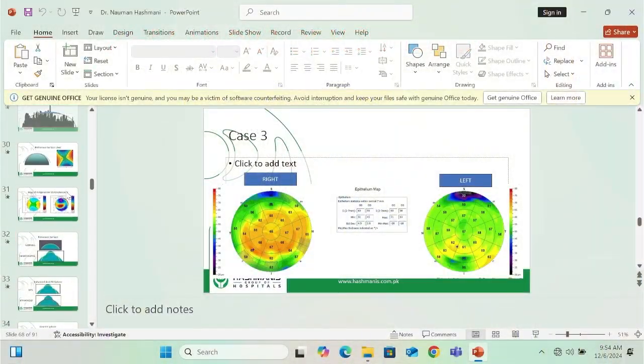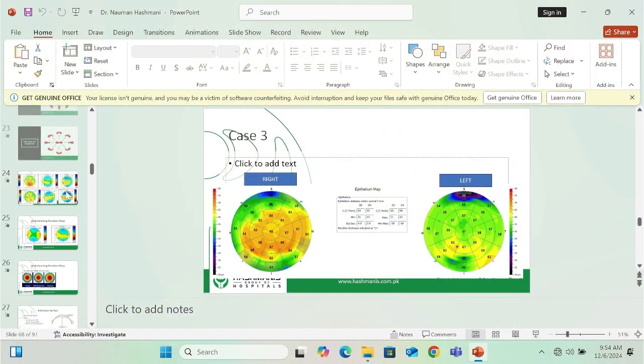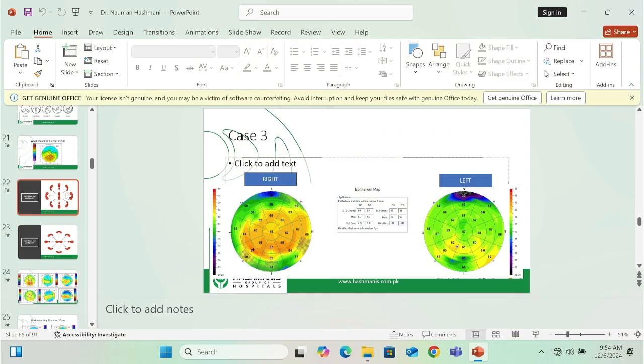Sure. Okay, so that's a very good question. Anyways, the Pentacam doesn't actually give you angle kappa. But there is extrapolation of that angle kappa in the sense of the horizontal displacement of the pupillary center. But obviously, I would recommend either looking at angle kappa clinically or using another instrument to measure angle kappa.